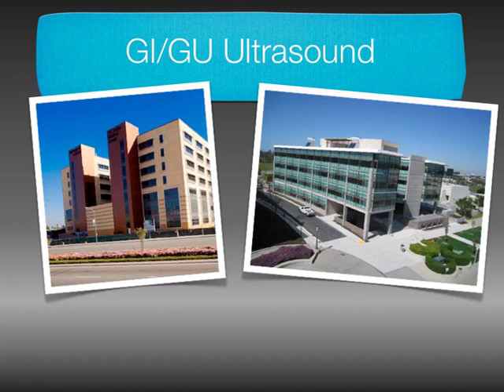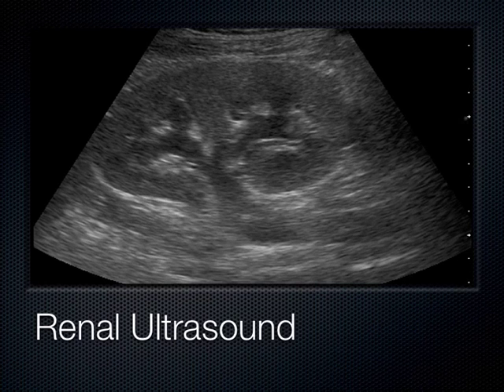So we're going to quickly transition today into the kidney and also some intestinal structures and the gallbladder. So this is the kidney, and you can see it here in all its splendor and glory. But to talk about the different anatomical parts of the kidney, this is the capsule of the kidney out here. Now the capsule is a very rigid structure, and when the kidney expands, it's got nowhere to go, and so it causes the patient a lot of pain if the kidney gets obstructed.